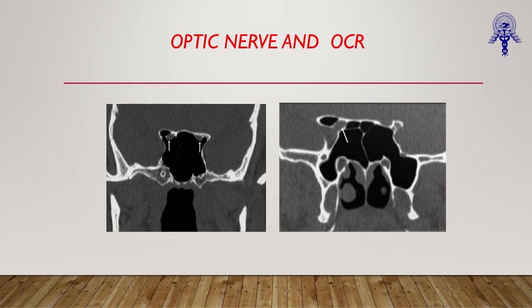One more important thing, there can be septa in the sphenoid sinus, which is attached to the internal carotid artery. And therefore, if you are doing any surgery in the sphenoid sinus, if you just bite a septa which is attached to internal carotid, you can cause a lesion of the internal carotid artery and life-threatening bleeding. So that is why you need to read the anatomy very well, and these are the areas of the optic nerve which I have shown you.